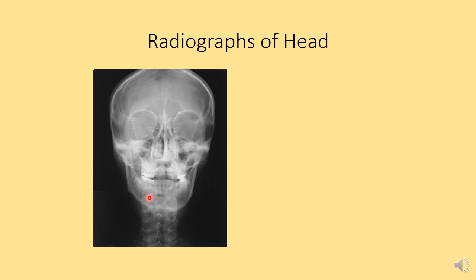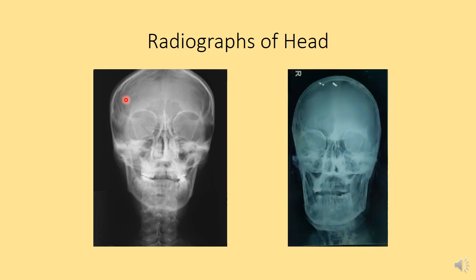In some of the x-rays, you will see outer and inner tables as well, separately. As you can appreciate here, there are two lines for the vault. They are because of the intervening diploe between outer and inner tables, which can often be appreciated. Again here, frontal sinus on right side, and this is orbital margin, ethmoidal air sinus, nasal cavity, maxillary sinuses, upper jaw, lower jaw with alveoli, and this is infratemporal region.